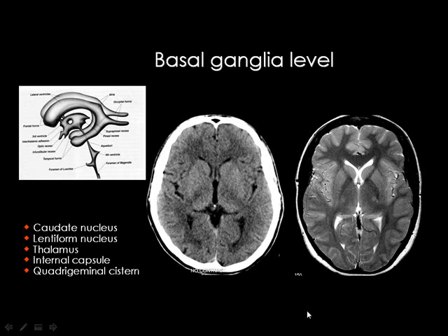In this area, you know that you are dealing with the basal ganglia. The basal ganglia are 4: the caudate, the lentiform, the thalamus, and the dentate nuclei. The dentate nuclei are present in the cerebellum, and the rest of the basal ganglia are seen in this section. Here you can see the region of the caudate nucleus, and in this area you see the lentiform nucleus, and on both sides of the third ventricle you can see the thalamus. And these structures are clearly visualized in the MR image.